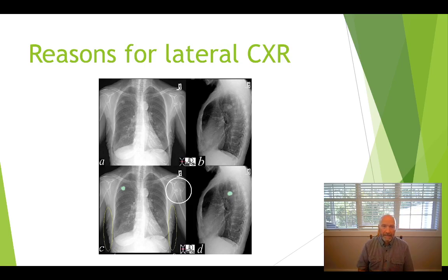Now, all that being said, I've been to seminars where radiologists say that their hospitals and their doctors have stopped taking lateral chest x-rays. The reason for that is because, again, if this were to be dead square in the middle of this lobe, and dead square in the middle of the lung in this image and dead square in the middle of this one, then chances are they're going to have a tough time identifying exactly where that is anyway, and the patient's going to go to CT. Even without that, this patient's going to CT.